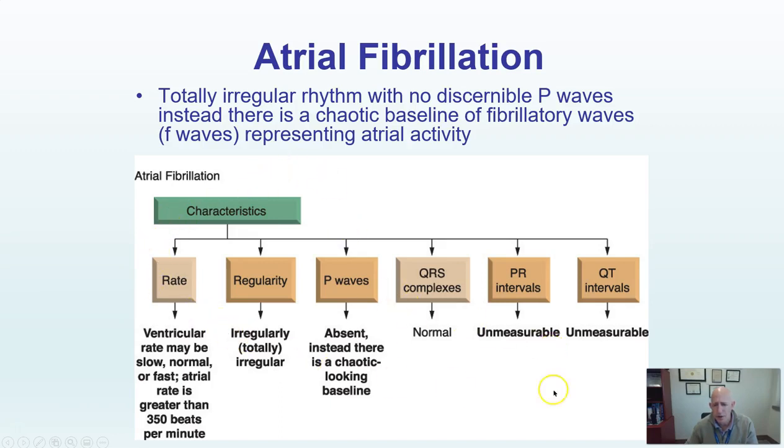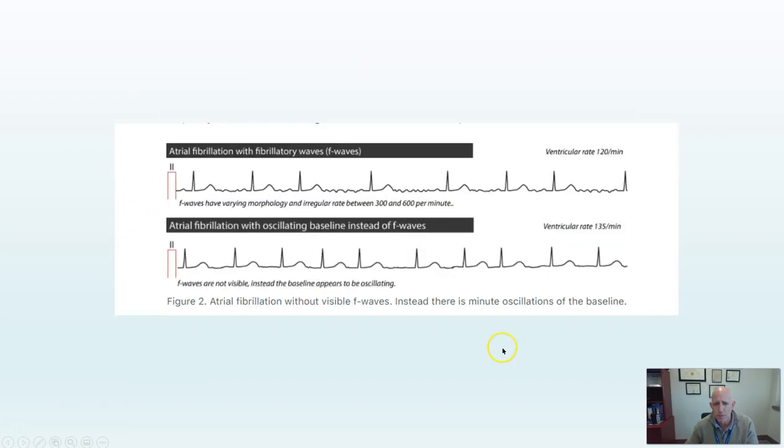Here's our little chart that we like to use if you want to look at what the differences are for AFib.